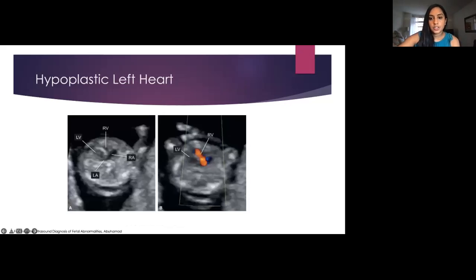And this is version B. So these are the ultrasound images of the second form that we touched on with the cartoon. So in image A, you can see the dilated ventricle that is hyperechoic with the septum bulging across into the right ventricle. And in B, you see no flow across the mitral valve here, but you can see it from your right ventricle.